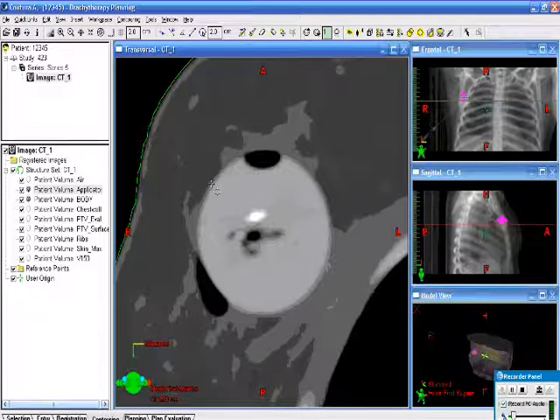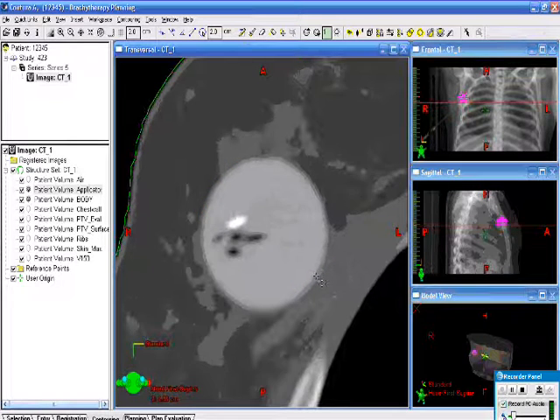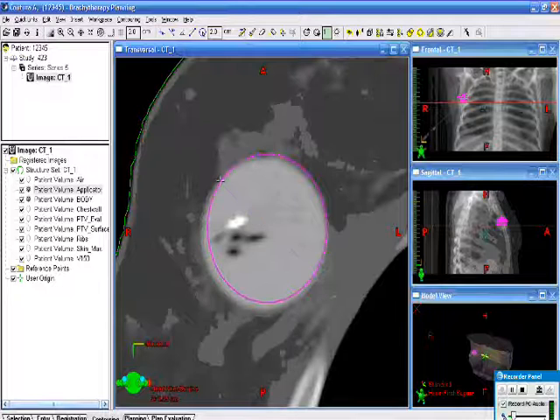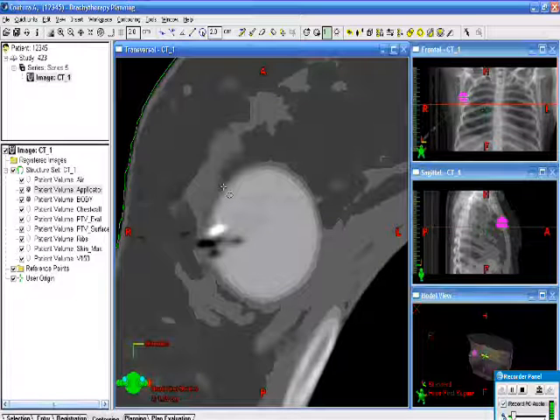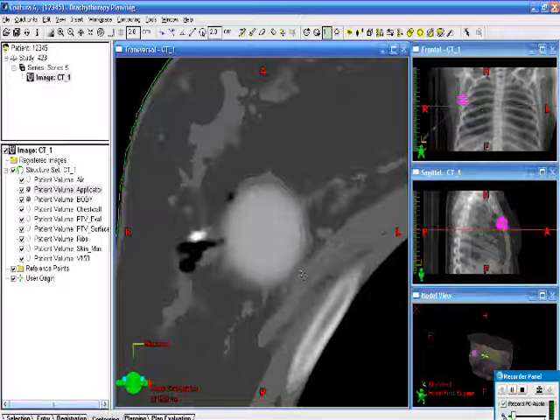So let's continue with this. And if you miss a little bit the diameter, we can come back and move some of those later, which I will do.